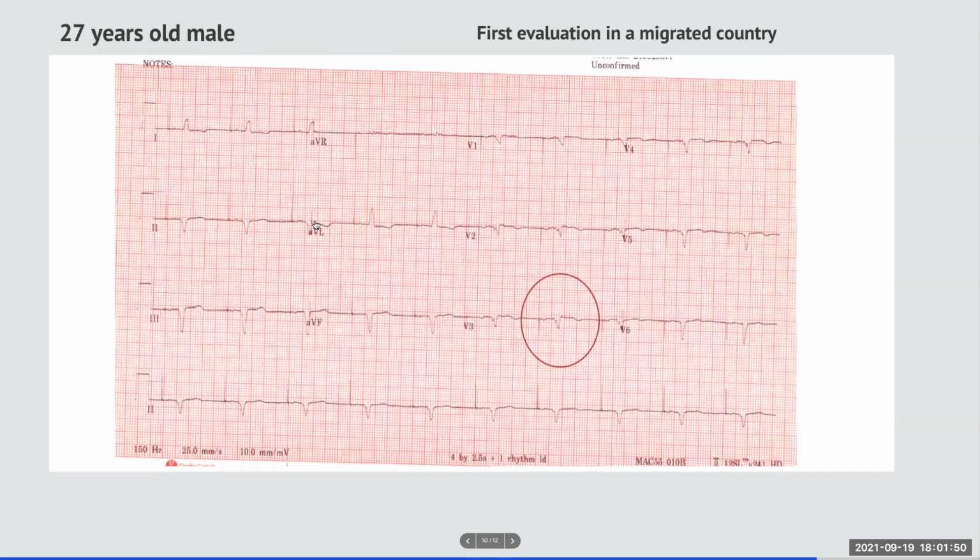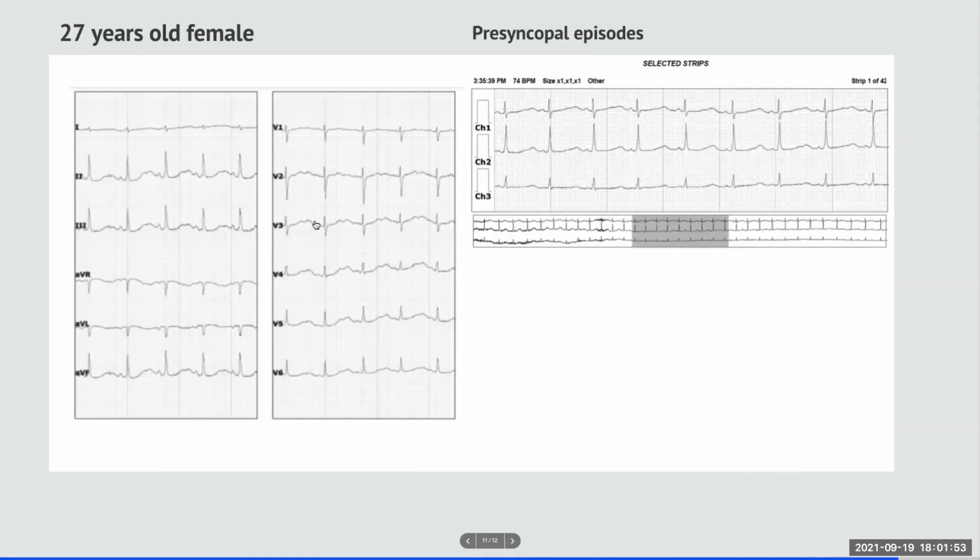And finally, this one. Okay. So this is the spot diagnosis. Who's going to diagnose this one? So look at this one here, just on the right side of the screen. PQRS, what's happening here? Look at the QT. Prolonged QT interval. Excellent, very good. So this is very much a prolonged QT interval.